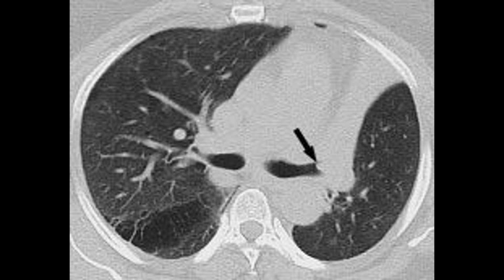Left upper lobe collapse is often one of the most difficult lobar collapses to recognize on chest radiography because the changes can be subtle and the opacity can blend with mediastinal and hilar structures. The key findings include a vague, ill-defined opacity in the left upper zone, volume loss, elevation of the left hilum, and the Luftsichel sign, which is highly suggestive of this diagnosis.